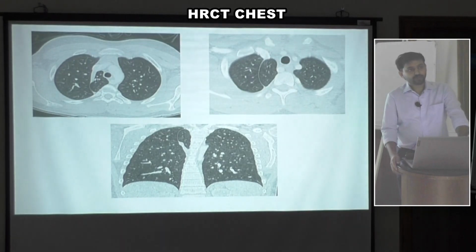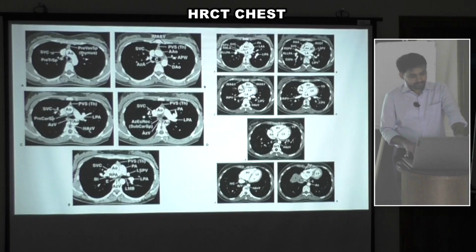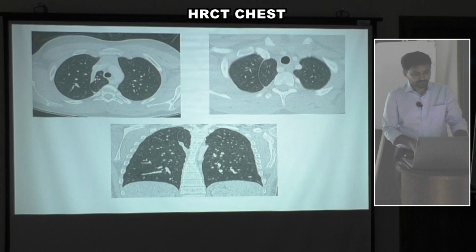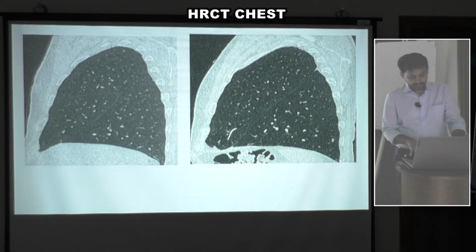This is the normal lung window. To read basic lung pathology, this window will be helpful. And this is the mediastinal window, which is mainly used to look at mediastinal structures like vasculature, lymph nodes, and any upper abdominal structures. So these are the 2 windows, one lung window and one mediastinal window. In the lung window, this is the sagittal plane, and another one is the axial plane.